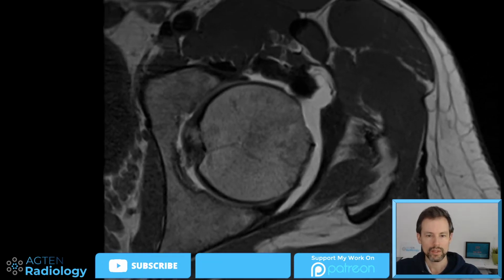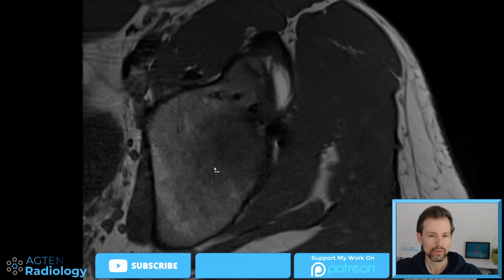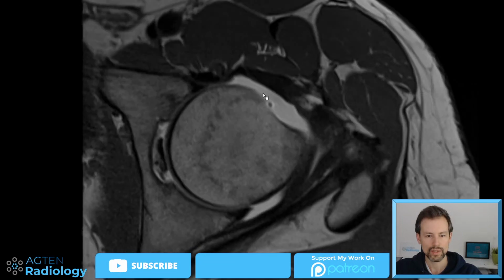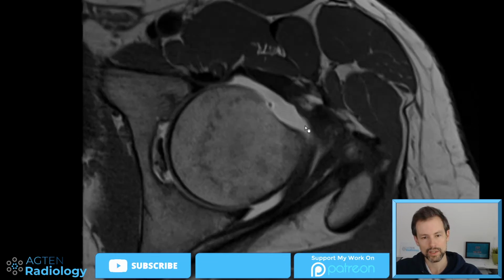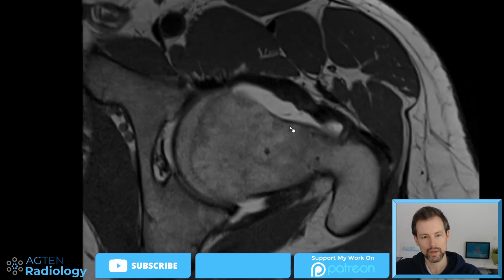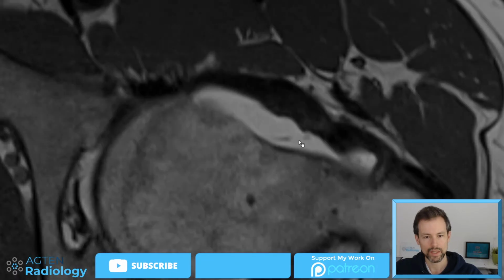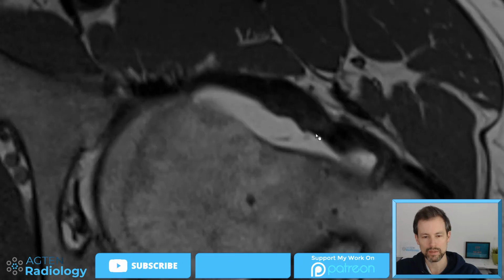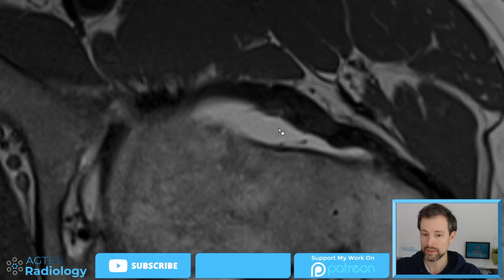Now, going here, you can see it was an arthrogram. And if we scroll through, we can see again these kind of susceptibility artifacts. And in the first surgery, they resected some bone here to do this kind of offset correction or resect the cam deformity. And then we can already see here some very tiny threads. They should not be relevant, right? You can't imagine that something like this might not even be continuous, right? But I would still report this.